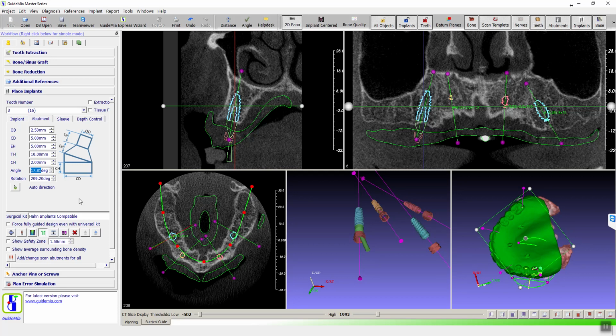Yeah, it's the same thing. If you create a longer shaft, you can just spin it around and find the best orientation for that. Yeah, and the ones I'll send you tomorrow will have the shaft on them. Okay. Otherwise, this is just for the situation where we don't really have multi-unit abutment. We want to customize without abutment, so we find a better angle for this.